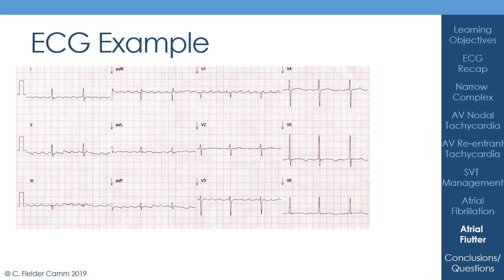So here's a nice ECG example. Again, have a couple of seconds to go through it. Okay, so hopefully you've had a chance to pause the slide and go through it. Let's start from the top. So no particular details here. From a technical point of view, I'll tell you that again, this is one of the ECGs that I got from a slightly dodgy ECG machine where the technical calibration strip on that left side is incorrect. This is actually calibrated normally.